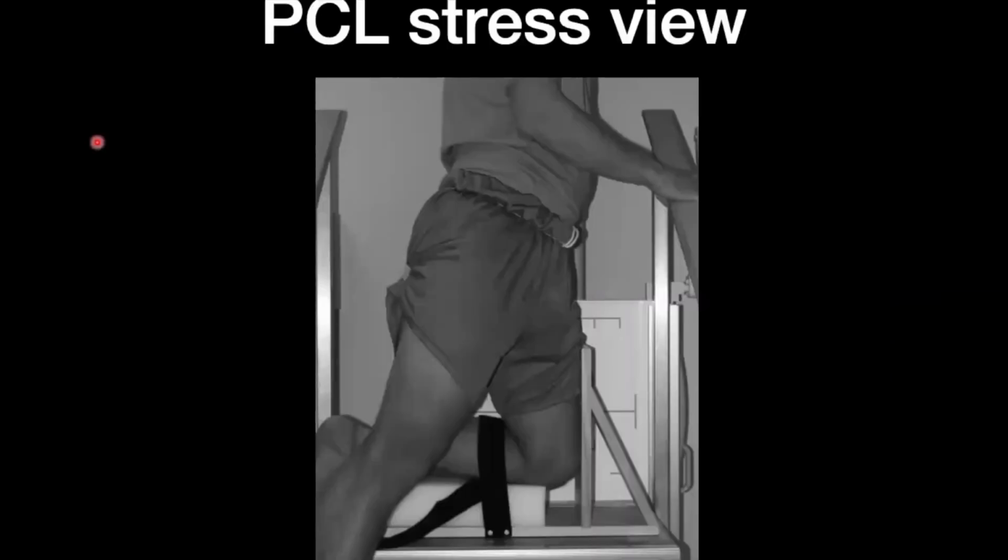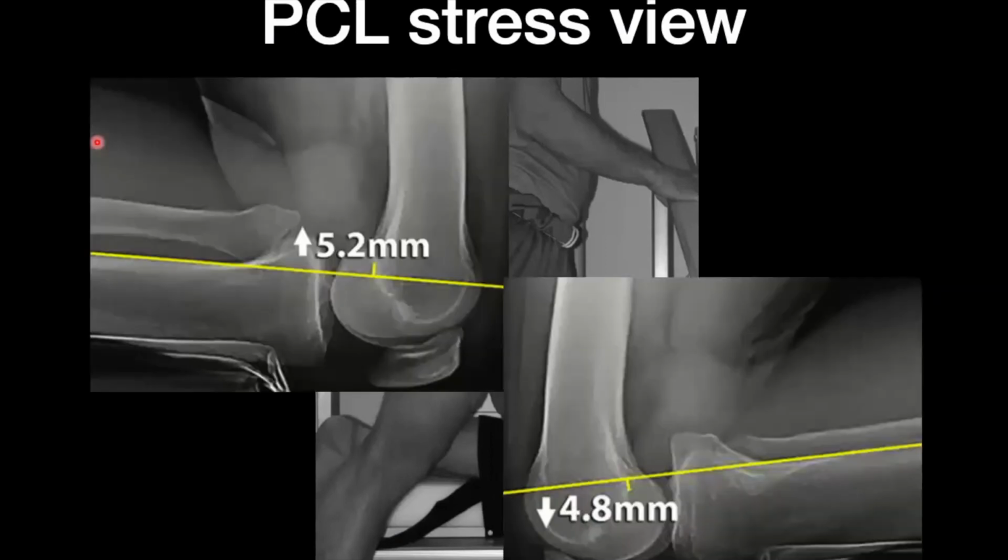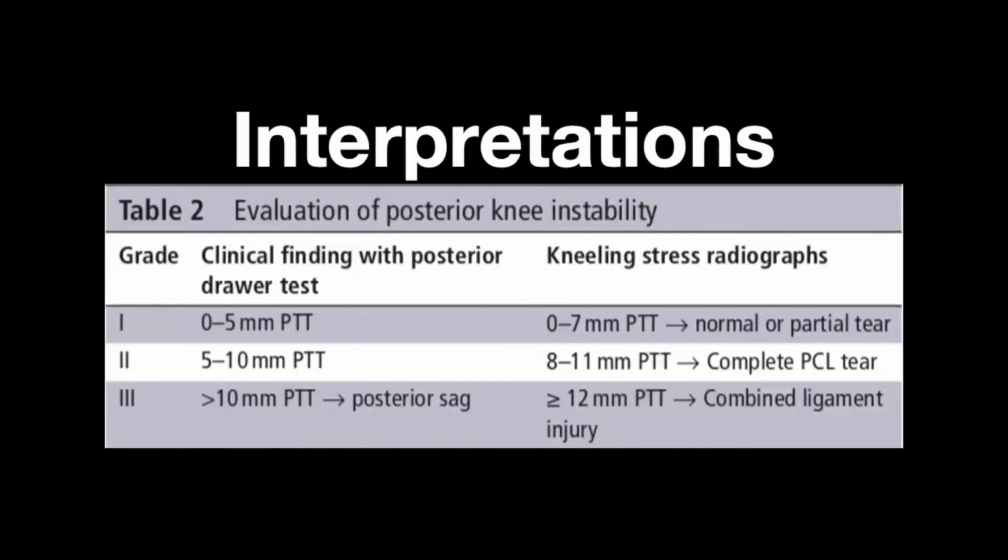To diagnose these conditions, the clinical examinations and PCL stress views are very important. These are the various ways how we do PCL stress views, and this is the interpretation. Grade 1 is 0 to 7 millimeter of posterior tibial translation. Grade 2 tear means 8 to 11 millimeter of posterior tibial translation. Grade 3 is more than 12 millimeter of posterior tibial translation.